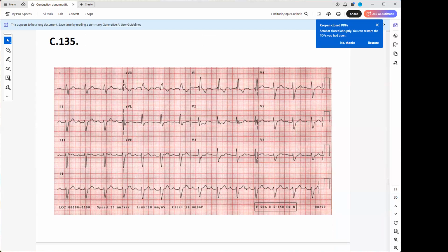Yes, this is Cheyenne, by the way. Yes, I can see it when we are talking. For this one, the rhythm is regular. Good. You have widened QRS complexes, so there's an intraventricular abnormality, and also in V1 there's the elongated S wave. V1 is not an S wave, that's a wide R wave. And the negative T wave that you have, that's the T wave. Oh, okay, I thought that was the S wave.